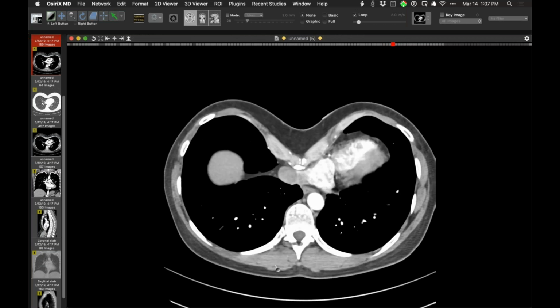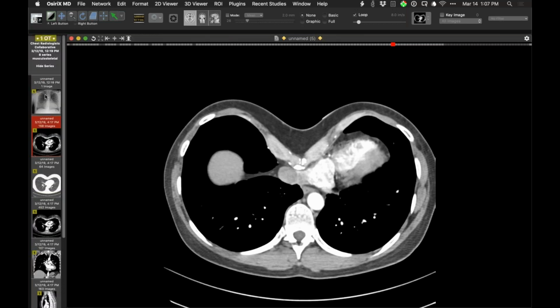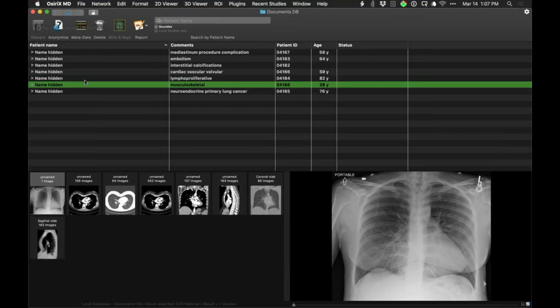David, are you there? You like that? I love it. Yeah, it was a very nice pectus pseudopneumonia. Yeah, that opacity that we see, which is nice.